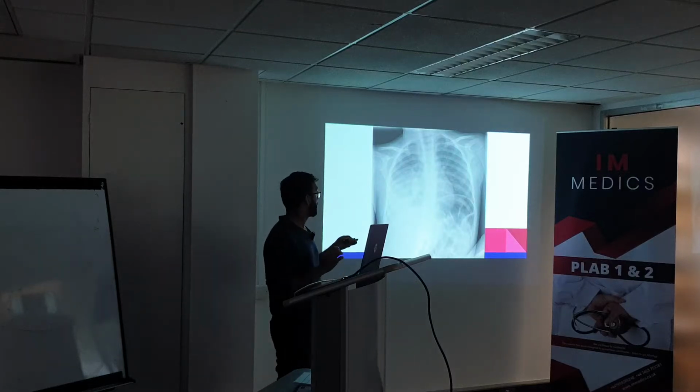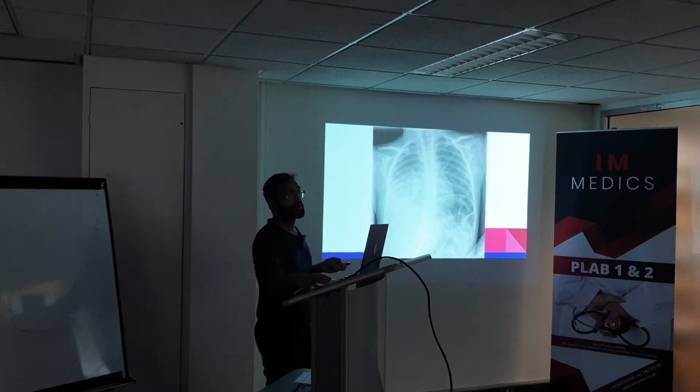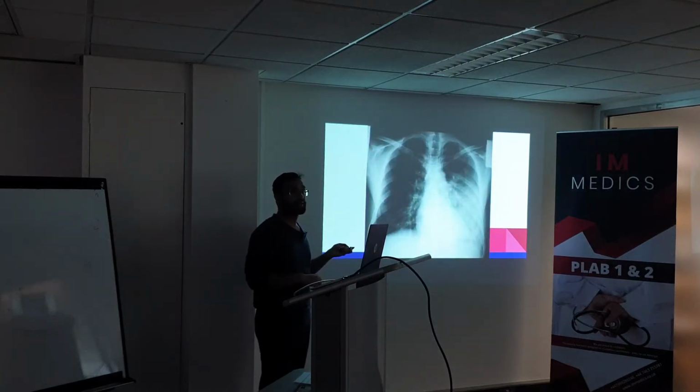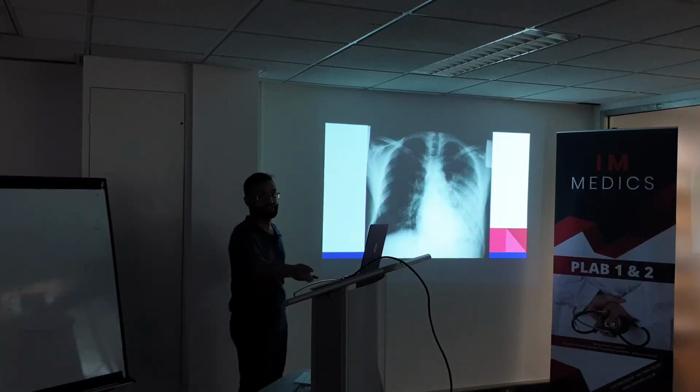And so here you have, anyone want to guess what this is? Is it pneumothorax? No, it's a consolidation. Here you're missing this whole field. So this is a right lower lobe consolidation. How about here? Yeah, left lower lobe consolidation.